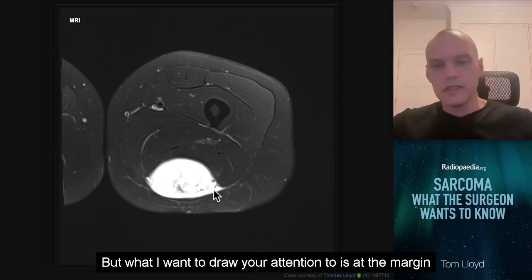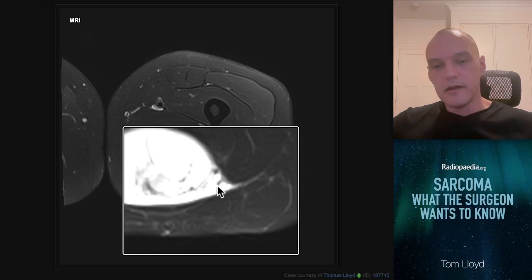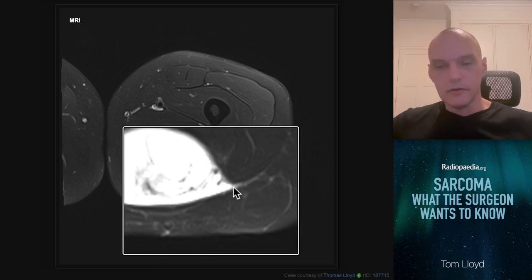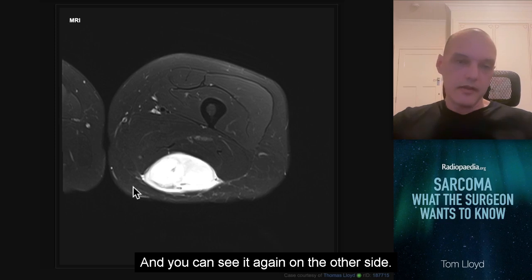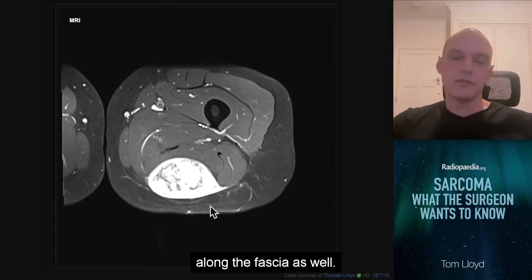But what I want to draw your attention to is at the margin of the tumour, you can see that there's this high signal intensity that continues along the fascia, the superficial fascia of the muscle. And you can see it again on the other side. On the post-contrast imaging, we can see that enhancement extends along the fascia as well.